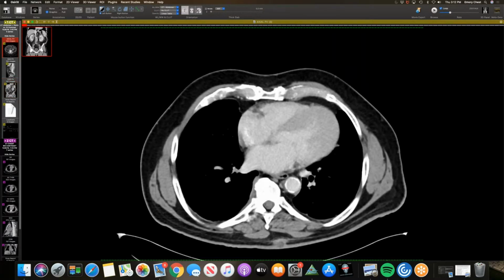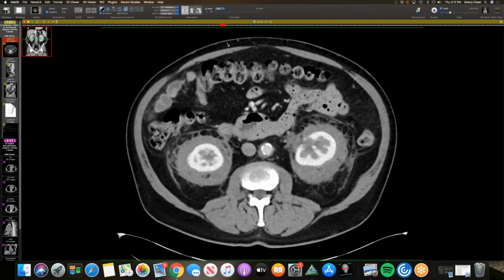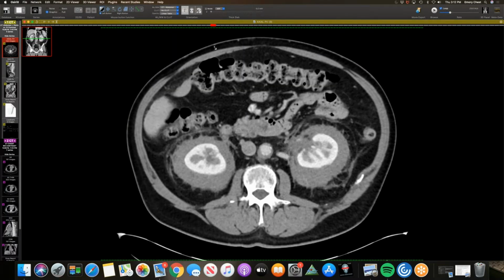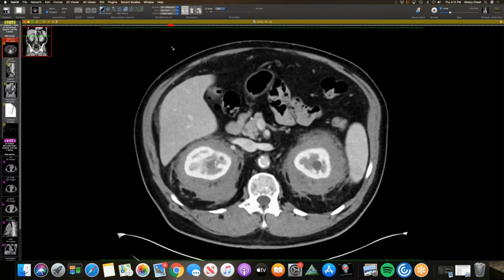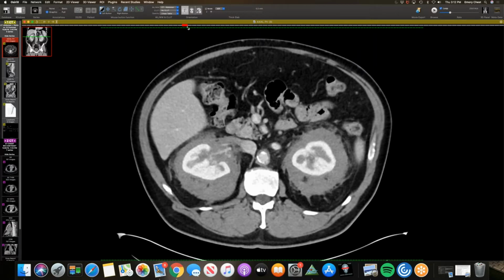Yes. Because I've seen cases where they don't light up, and that would correspond to a diagnosis of fibrosis, which is what Erdheim-Chester can lead to. So if it's a mature fibrosis, then it would be much less active on PET. Might even be cold. But so it certainly wasn't a light bulb. It was just mild uptake to my eye. But this has been an ongoing issue for years for this patient.